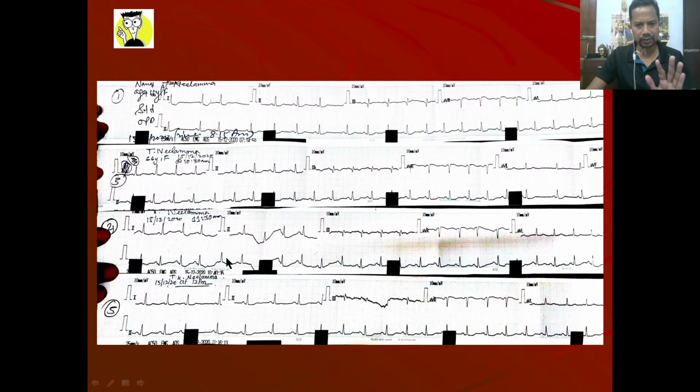So this was it. Yeah, lead 3, again elevation. So again I thought this is MI. Now you look in lead V1. Will come to V1 in the next slide. So this is early, then after a few minutes, after 1 hour or something, the changes are slightly progressing.